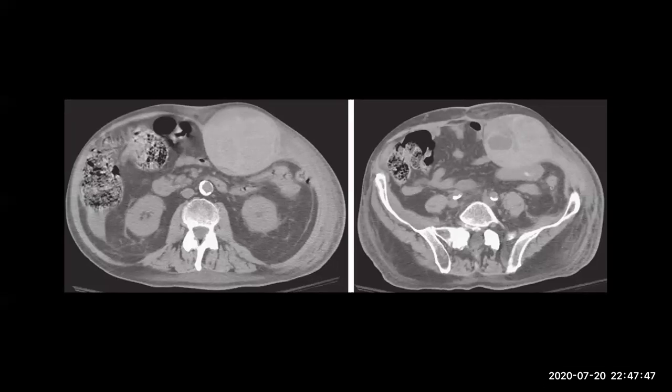From where is it more common? Myeloma. Melanoma. Yes, I think the kidney will give metastasis to the muscles, okay? So this is a patient with anticoagulant and with hematoma of the left rectus muscle.